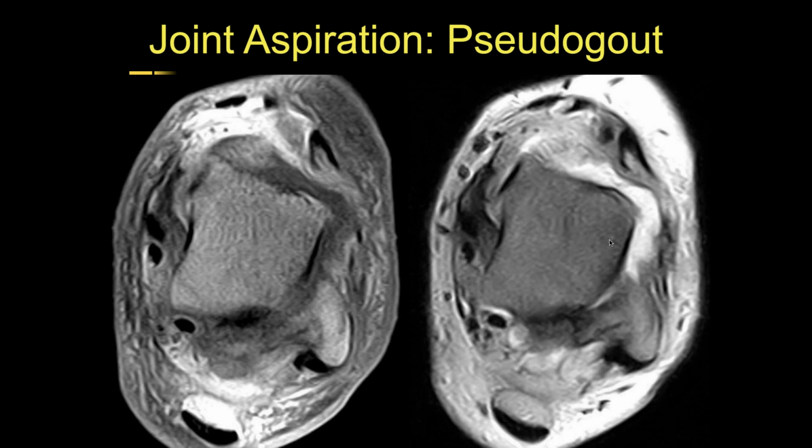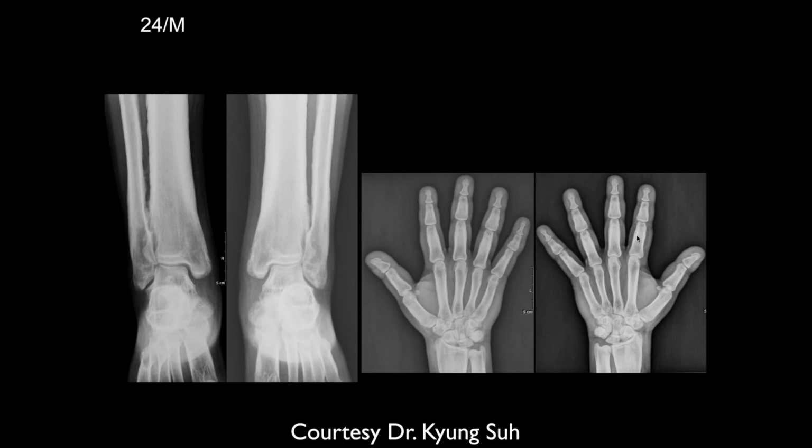There's a lot of debate about what pseudogout really is, and some people believe that the calcium pyrophosphate is just destruction of the bone that you can see in any kind of degenerative joint disease. But when it's associated with what looks like a hot inflammatory reaction from the body, then that's generally called pseudogout if you can't find any infectious agent or uric acid deposits. So this was pseudogout. Okay, Michael?